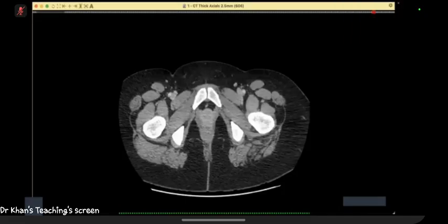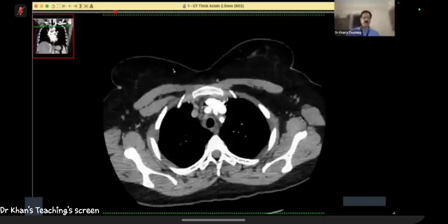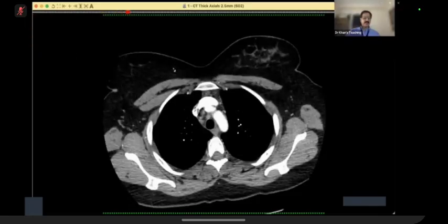Hello? Yes, sir. Okay, madam, this is a long case type of scenario, but I am going to show you a CT chest, one sequence, a CT abdomen of the same case, one sequence, and then I'm going to show you a brain MR.